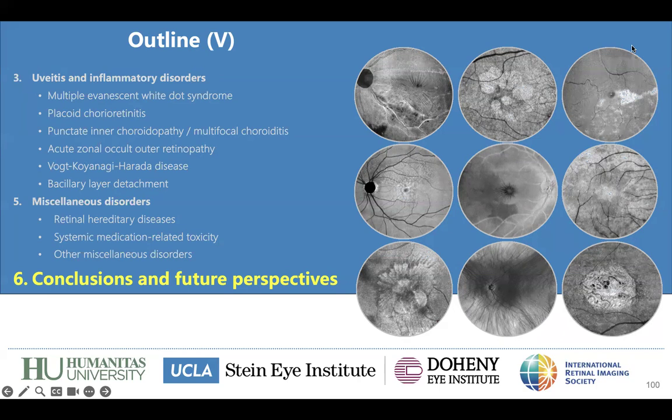In a normal eye, the lowest point might be in the nuclear layers, and we can have a perspective of the outer nuclear layer mainly and fluid disposition. What do you think about this kind of imaging and the possible applications?